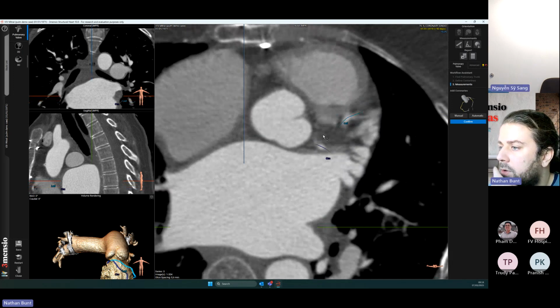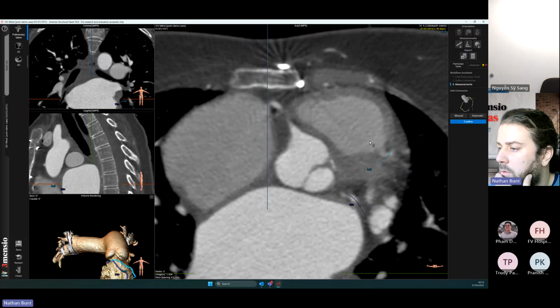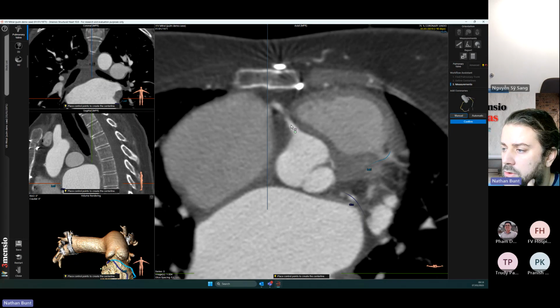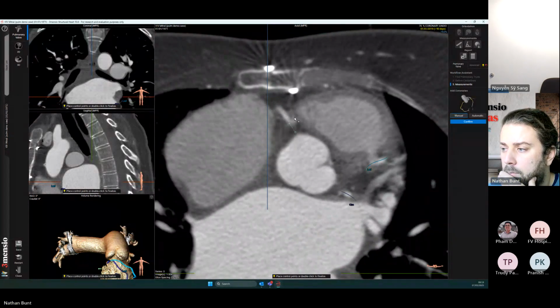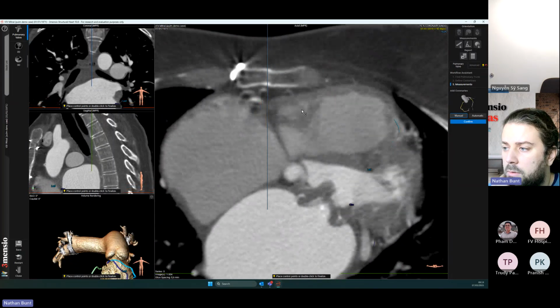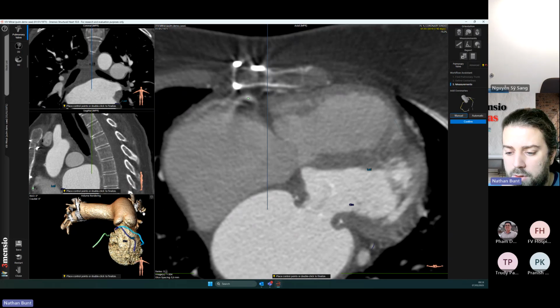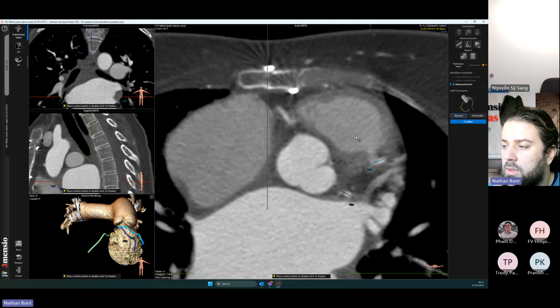And then the alternative is to do it manually. With a manual definition, we can just focus our MPR view on a vessel, click on manual, and then just start clicking the center line into the anatomy. And then you still see that a center line is being formed between my dots. Any questions here?